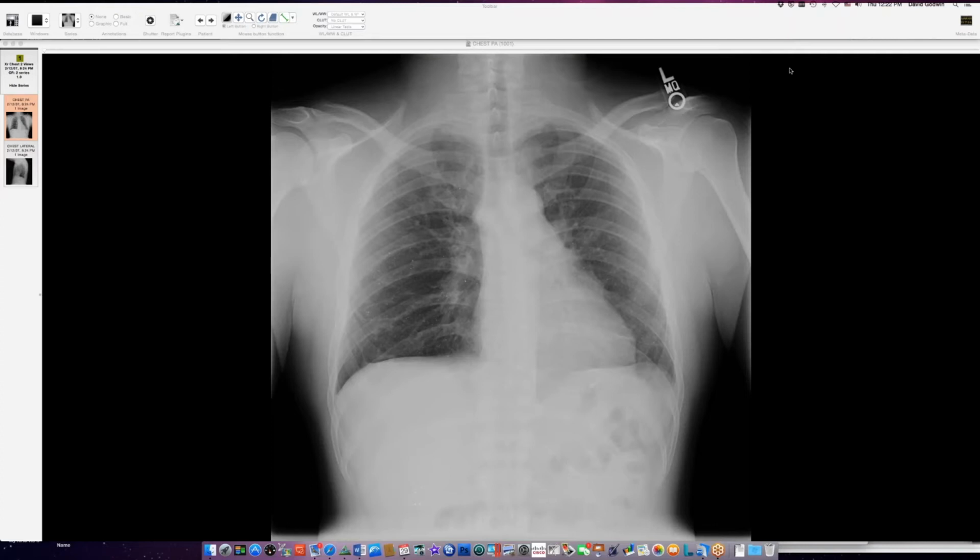So can people see a radiograph? Yep. Okay, this person has all of these tiny little, very bright dots throughout the lungs that were interpreted on one exam as artifacts, and on another as aspirated barium. These were there on a radiograph at a time point a few months different, so they're not transient sorts of things.